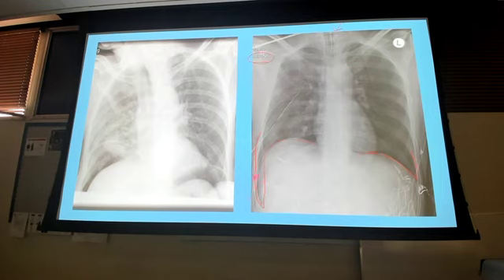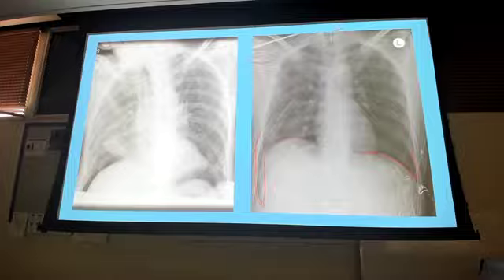What do we call this? All right, let's take a step back. If I have a chest tube, what conditions am I thinking they had? A pneumo or a hemothorax, right, or a hydrothorax or something along those lines, either one. Do I see that on this x-ray? Why not? The chest tube did its job, right? So great. So chest tube is clue 1.